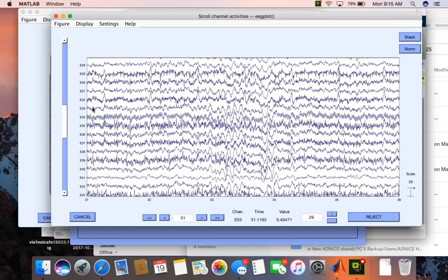Okay, so these channels right here, channel 34, 35, kind of this 34 through 39 range. For whatever reason, I don't know if it's a flaw in the instrument or a flaw in the cap, but I often have this kind of noise. If we were to do a notch filter at 60 hertz, you would find that this is 60 hertz noise. So this is that instrument picking up the 60 hertz noise in the room. If you look at this channel, I appear to have both 60 hertz noise and a heartbeat superimposed on that channel.